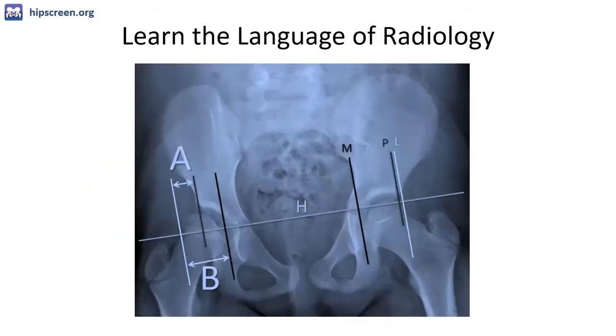Let's get into the majority of the talk. I want to guide you through learning the language of radiology, because it is like a foreign language, and better understand all of the landmarks that you might see on an x-ray so that you can speak the same language as the radiologist and as your orthopedic surgeons, and be in a better position to make measurements on your own.